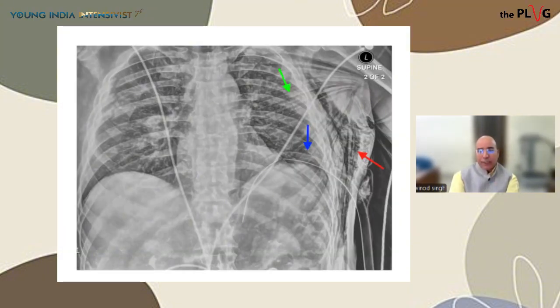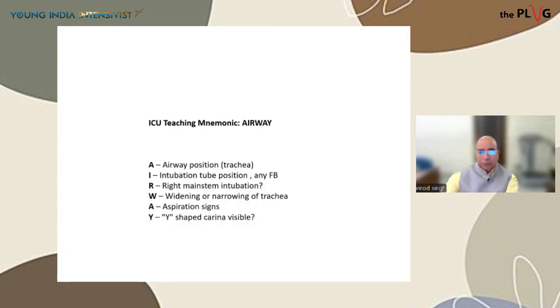You can see all the findings which occur in trauma: rib fracture, pneumomediastinum, a chest tube, and also a large bilateral subcutaneous emphysema, mostly on the left side. So this is the importance of looking at the subcutaneous spaces in patients with trauma.